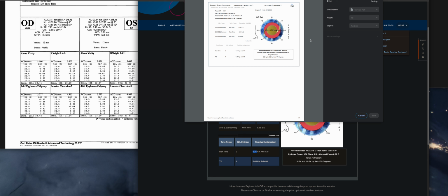So yeah, it's a lot of number crunching, and one thing that I'm not showing is that you should be double checking your data and just make sure there's no transcription errors, because that'll be bad.